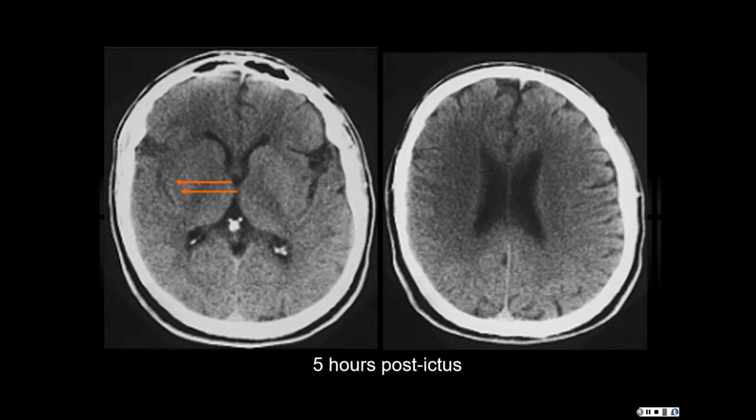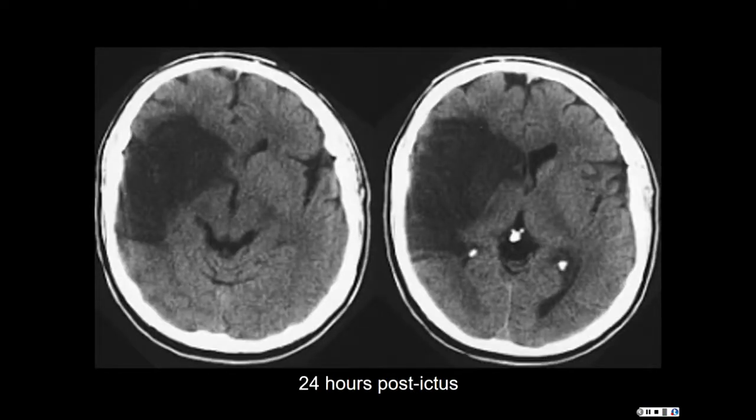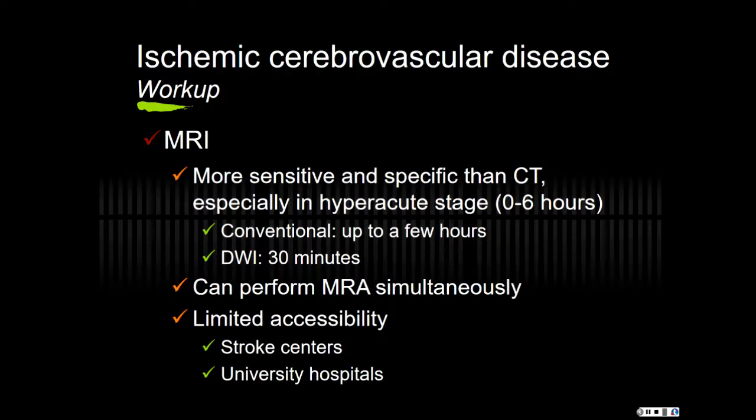Cortical ribbon sign, I was playing with my graphics. By the way, this is different from the other patient I showed you earlier today. So there we are a few days later. That's a massive infarct. I don't think that's 24 hours. I think it's more than 24 hours. All right, more of the workout.